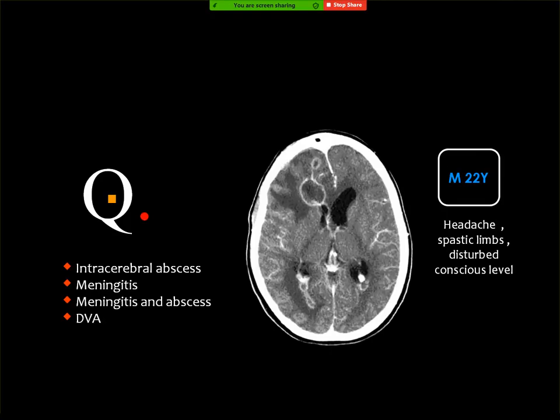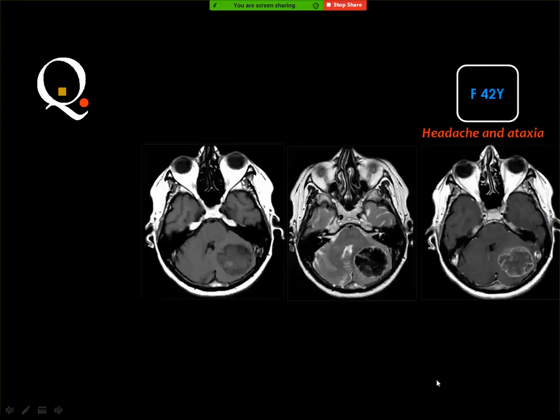Post-contrast images show leptomeningeal enhancement. Also, we saw a frontal ring enhancement with perifocal edema. This is meningitis with brain abscess. And there is also one additional finding. Meningitis and abscess. Also, still there is one more finding. There is ventriculitis also. Yes, and there is enhancement of the wall of the ventricles on both sides, and this is ventriculitis. Okay.